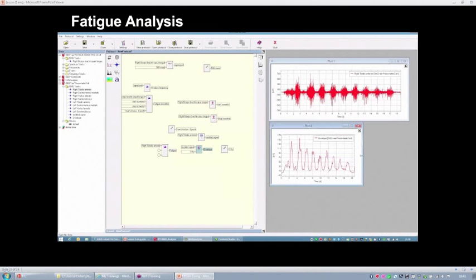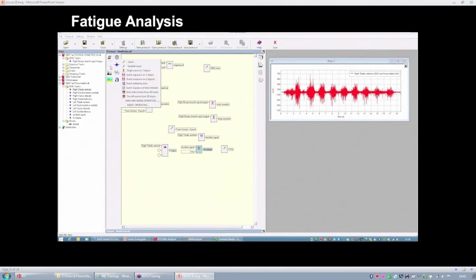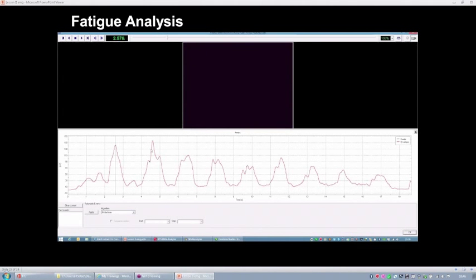So now I will consider the fatigue around the peak value. So this can be another option. I have to identify a sequence of events. I will consider the sequence of the peaks of the envelope of the signal, so that they will be, for example, this value, this value, this value.